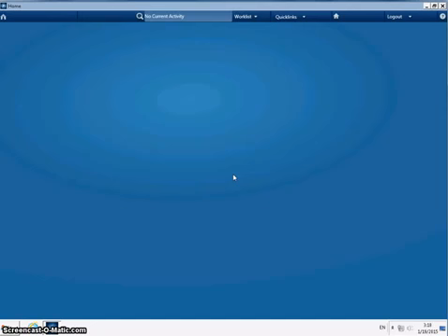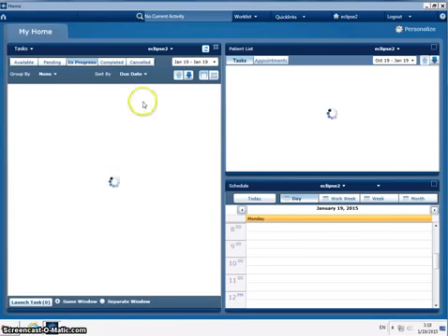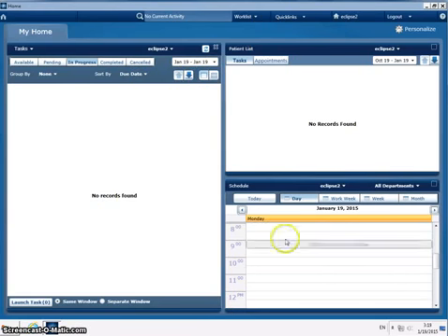And then this takes us to the home screen for Eclipse. It may look very slightly different, you may see some things displayed in this area here, but essentially it should look pretty much the same as you can see here. So we can see there's some tabs across the top. These tabs here, to be honest, aren't things that we're overly interested in. If we were in a clinical department, these are what we could use to schedule our patients, etc., and tasks that we might have to do.